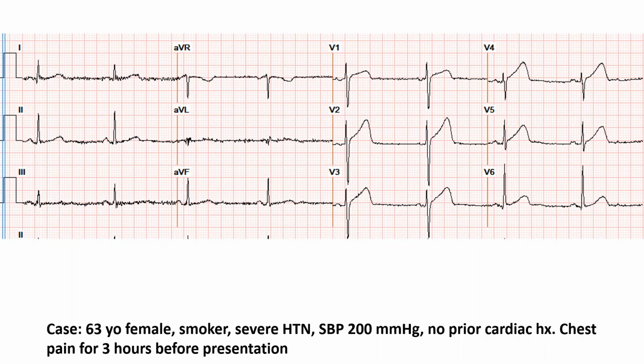I want you to know the diagnosis, because I recognized it and I wrote it in my report even before the autopsy, way before the autopsy. Somebody mentioned PE. No, she did have acute LAD occlusion. It's hard to have two diagnoses. Here is what I wrote in my report.